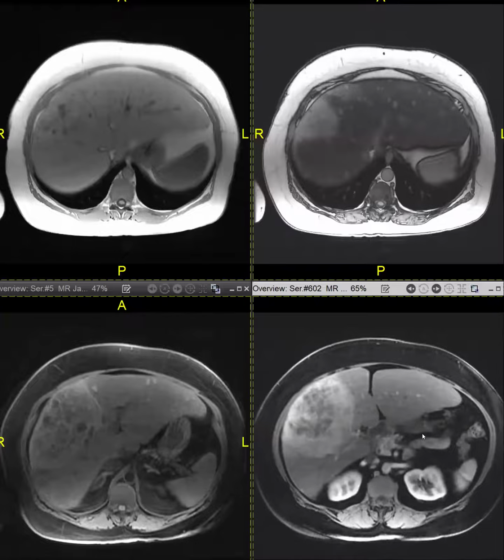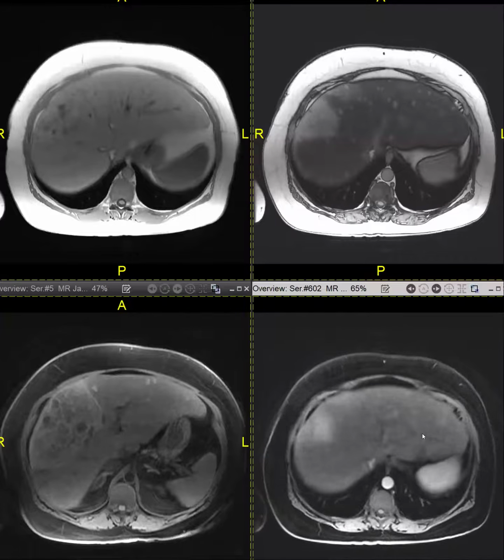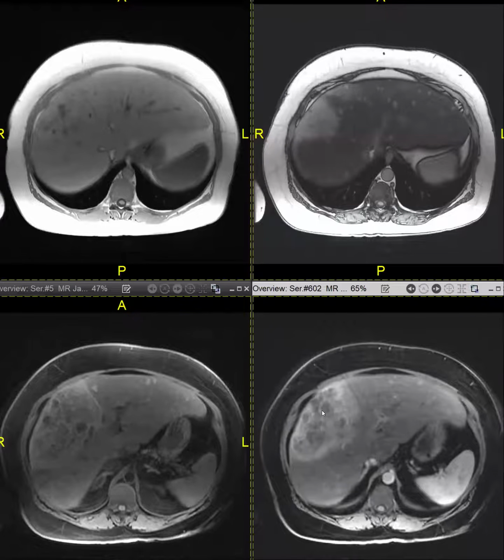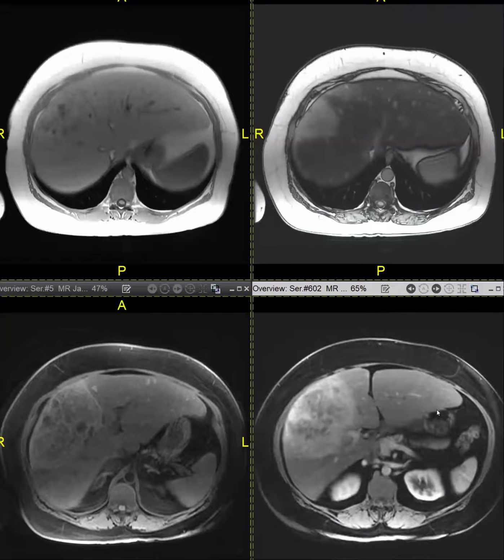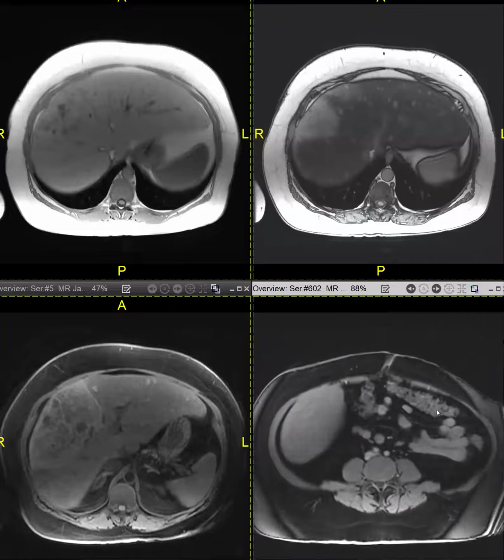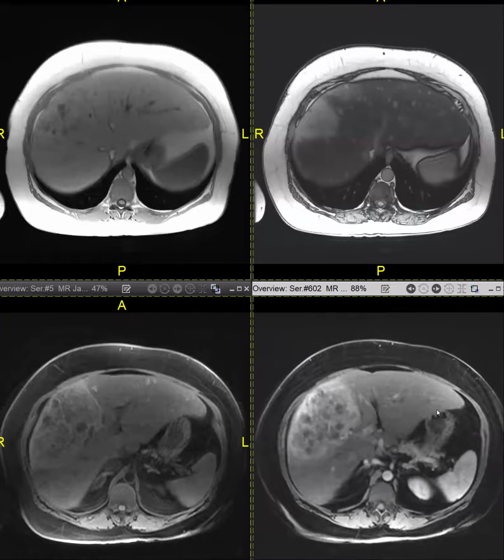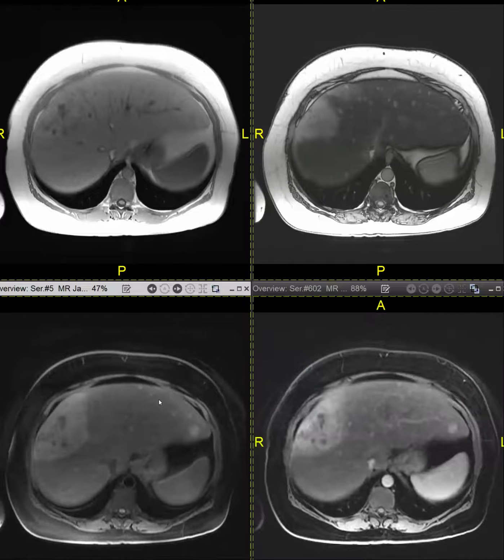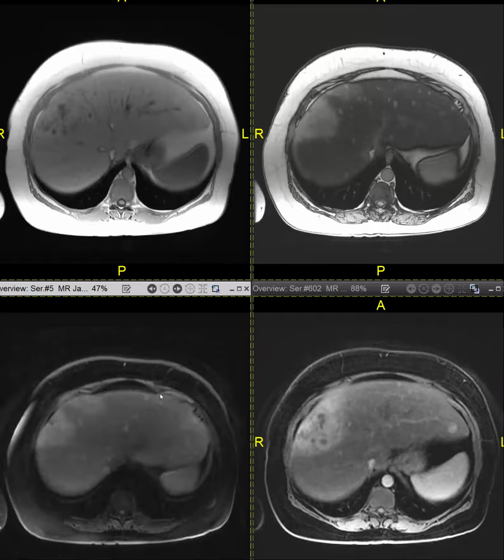Right. So these patients are very difficult to manage because now the patient is at risk, because one of these lesions could turn into HCC, but aside from getting a liver transplant, you really can't get rid of the rest of them. So this is not easy management for these patients. This particular patient gets close follow-up to monitor these lesions. And okay, so I'm going to stop sharing.